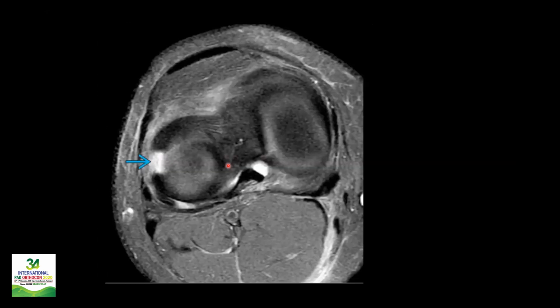And this is again an axial image of the same patient, where you can see that these two edges of the menisci are separated. And when the slices were crossing through this region of the MRI, you were not appreciating any meniscus in this region. So remember, if you find an absent part of a meniscus, like there you're seeing a normal anterior horn but missing the posterior horn, it's more likely going to be a radial tear, and you should be searching your axial images more vigilantly.